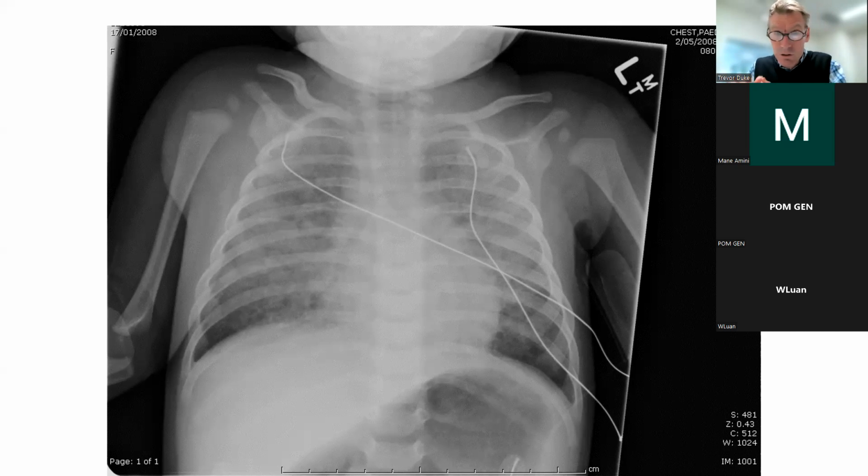So you've thought of viral pneumonitis or pneumocystis pneumonia, and there's obviously one other condition that could give you an appearance that's quite like this. Come on, what else? TB? Yeah, good, TB. Often people suggest TB first, but I was trying to get you to think more broadly, and I think you've done that. So yes, this could be extensive TB. It's not quite a miliary pattern, but it's a slightly more dense pattern than a miliary pattern. But it could be extensive bronchopneumonic tuberculosis, or it could be viral pneumonitis, or it could be pneumocystis.